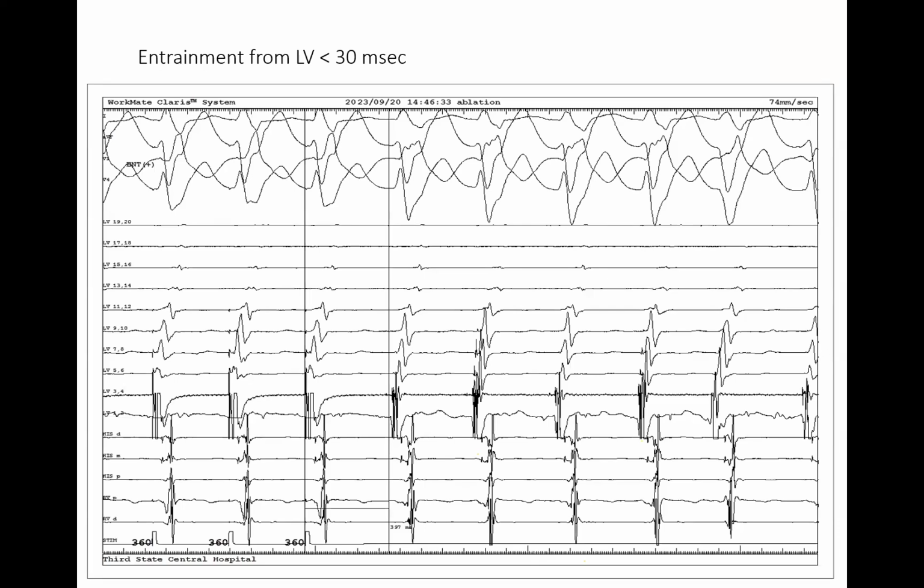18. Okay. And then there is also coexisting simultaneous double tachycardia. There's a case published by a Japanese group. Also, there are some other case reports where the patient has AVNRT, suddenly switches to fascicular VT, and goes back and forth. Yes, and this is very difficult. Double tachycardia. Those are very rare forms, but it happens.